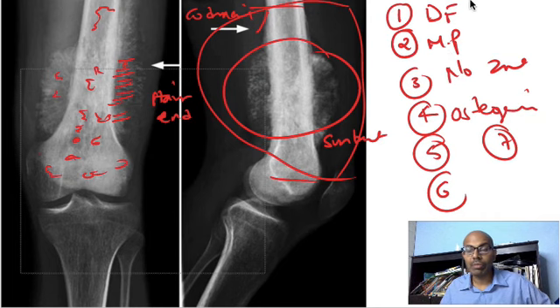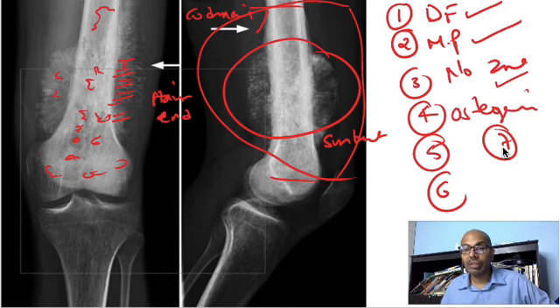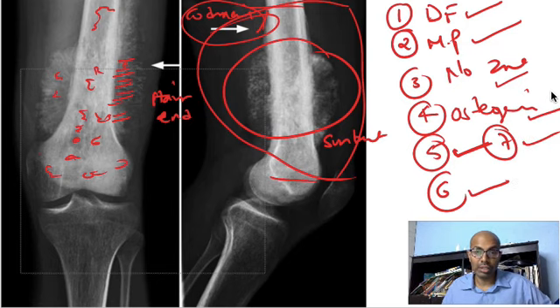So let us recap. The most common location where osteosarcoma occurs is the distal femur. Where does osteosarcoma occur? In the metaphyseal region. There is usually no zone of demarcation. It is either a moth-eaten or permeative appearance. The matrix has osteogenic potential. Then the periosteal reaction is typically hair-on-end or sunburst appearance, and you have the Codman's triangle, right? And then the size is quite large and aggressively fast growing, and the cortex is destroyed. The corticomedullary differentiation is lost.